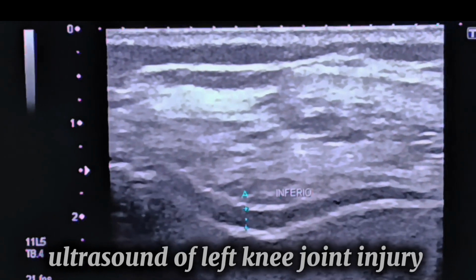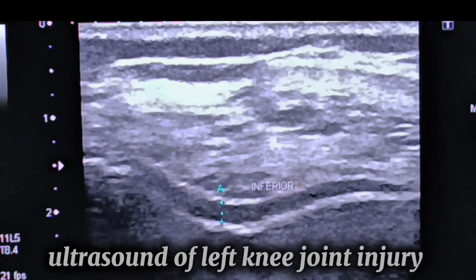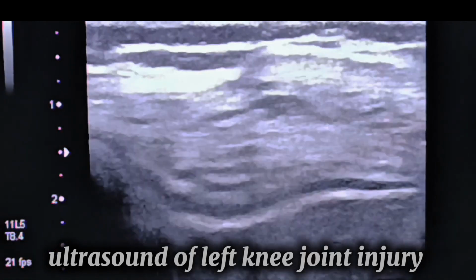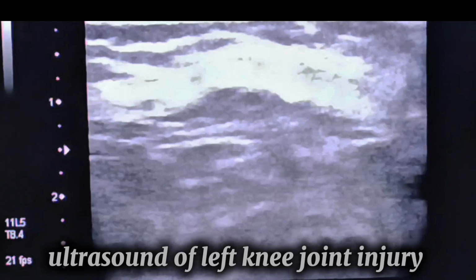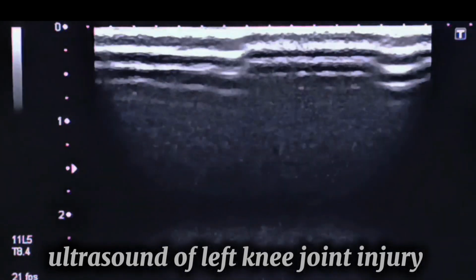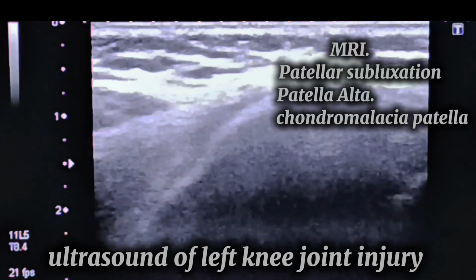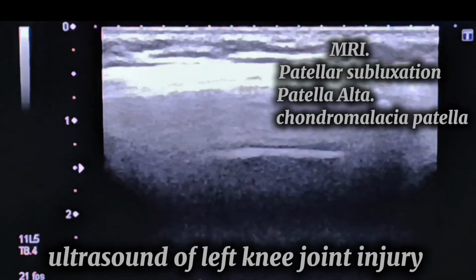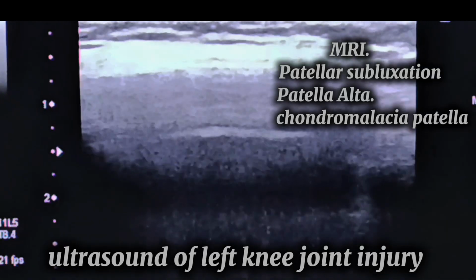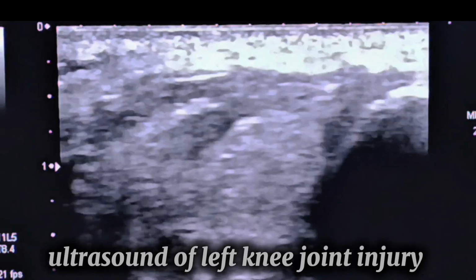the infrapatellar pad. In this case presentation, the clinical background showed history of trauma to the left knee, presenting with pain, localized tenderness, and knee locking was the main complaint. The previous MRI reported patellar subluxation, patella alta, chondromalacia patella. Ultrasound was requested for further evaluation.